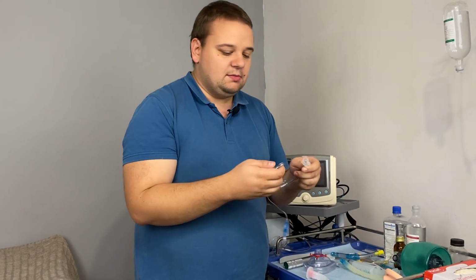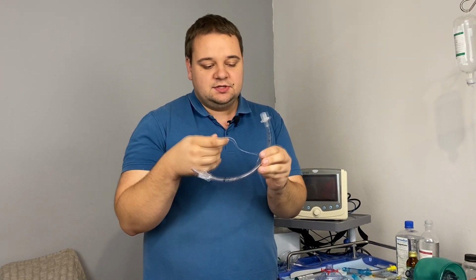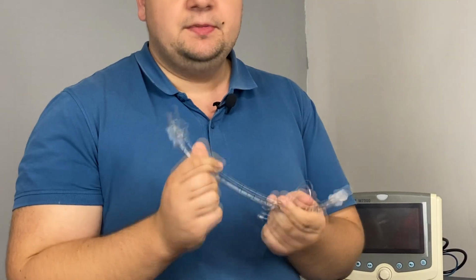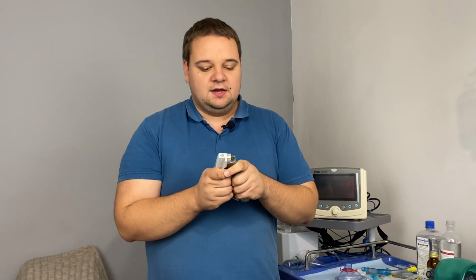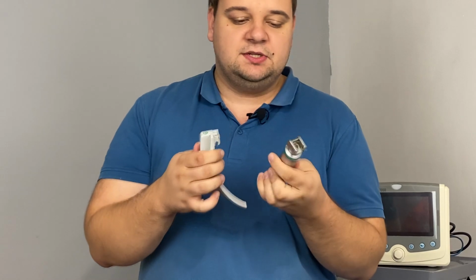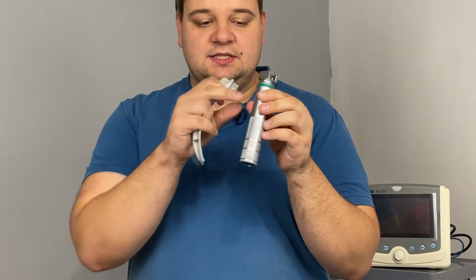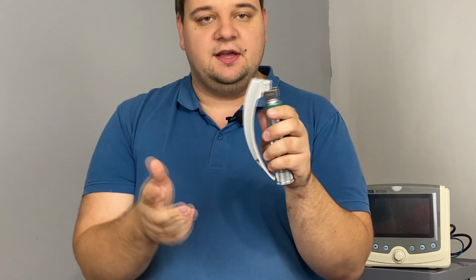And now we are coming back to the intubation. So you see that it's a rather plain device, but to use it, we must have special skills, special equipment and personnel. Now, to do the intubation, we must have a laryngoscope. There are multiple types of these devices. This is one of the basic ones that you will see in adult hospitals. It has 2 parts. This one is a handle, it has batteries inside. This one is the blade, they are connected together.